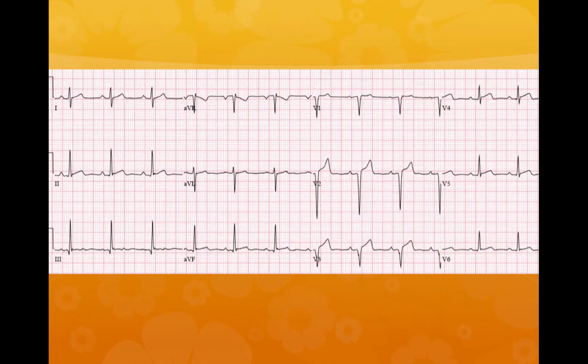Well, first of all, we'll look at the ECG from the last video on ST segments. So we'll look at, first of all, the rhythm. The rhythm, we can see that it's pretty regular. It's every 4 big squares. So that's about 75 beats per minute.